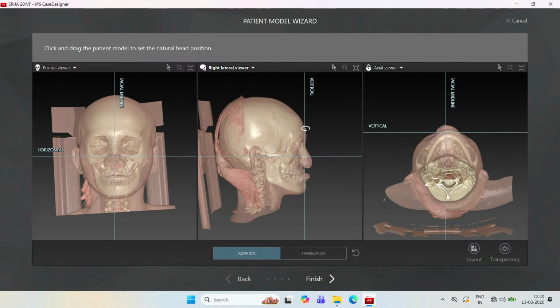I think there's some issue with this. It's okay, you can switch this on. No, I think it's completely fine with this. Until then, I can adjust with that. Can you switch this on? Yeah, okay.